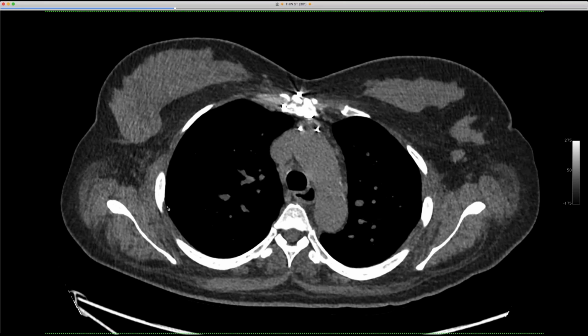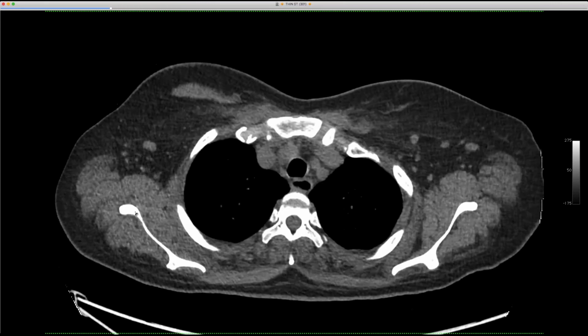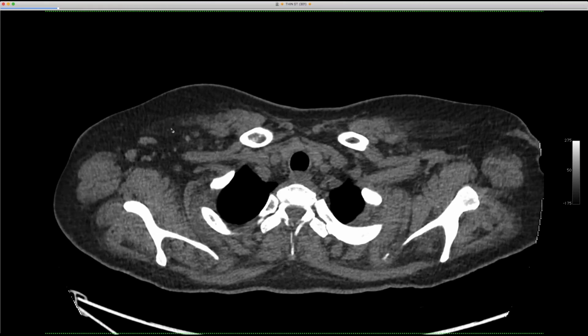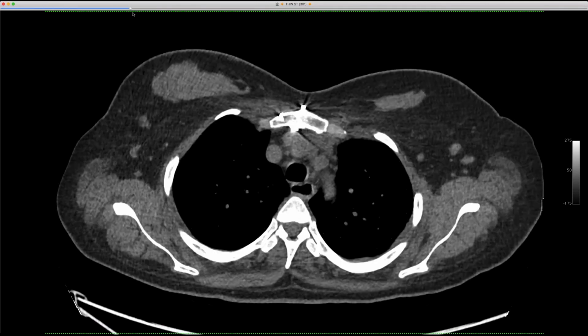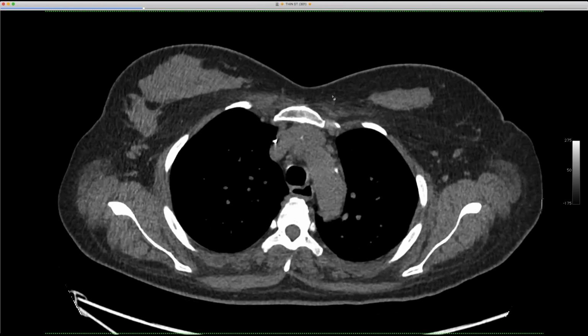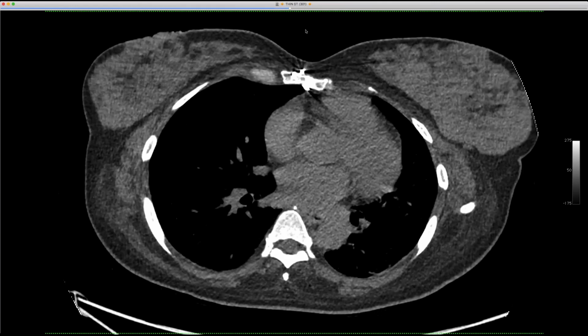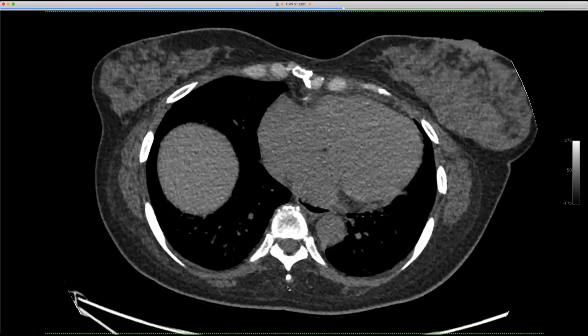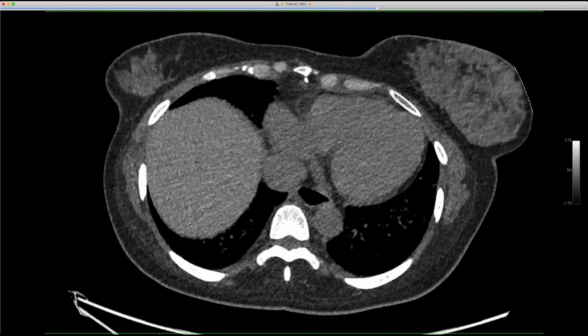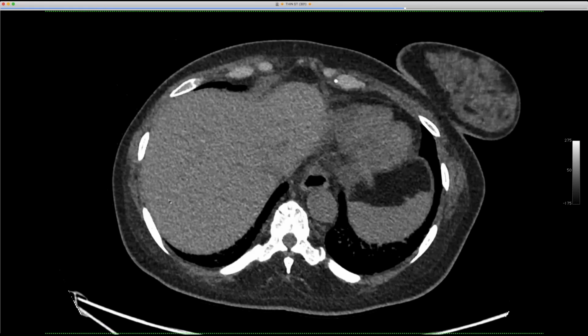But what was quite striking to us was this marked atrophy, fatty sort of metaplasia of a lot of her muscles. You look at this pectoralis muscle on both sides, and even the deltoids are getting a little bit thin. And then as you went down, her latissimus dorsi and her paraspinal muscles are very atrophied. Yet other muscles, serratus, are relatively preserved, and it's very symmetric.